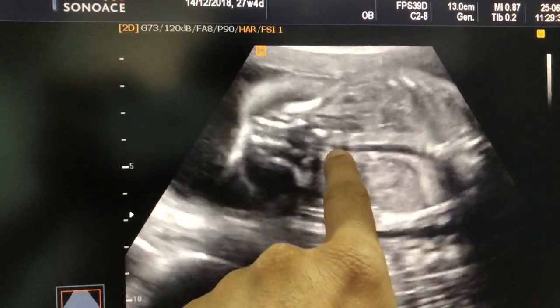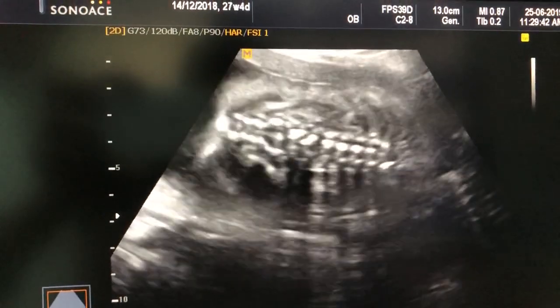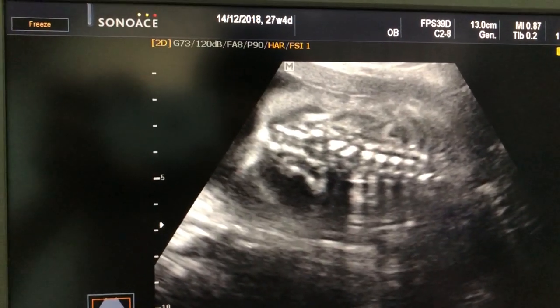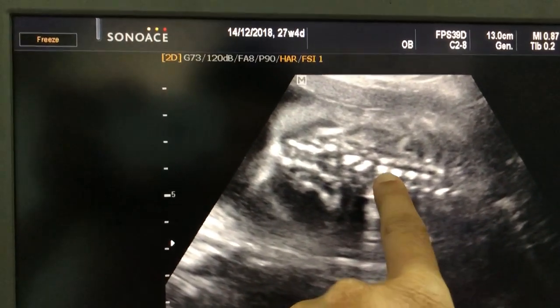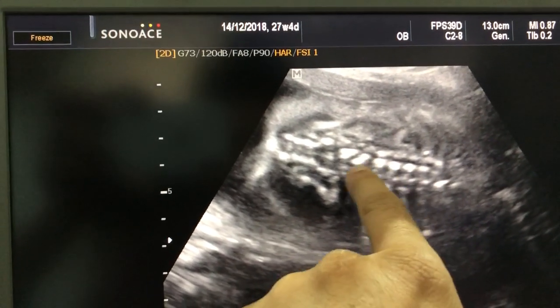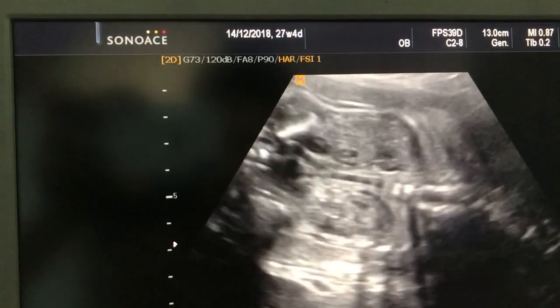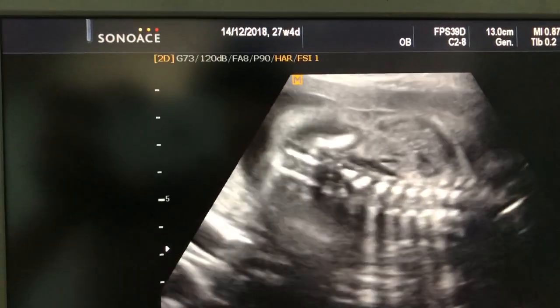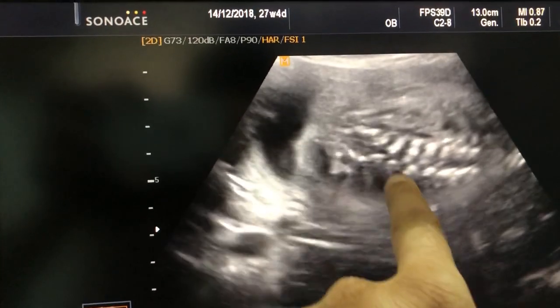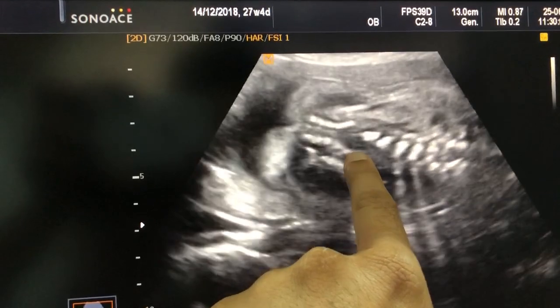and these spinal elements are also not clearly well aligned. You can see here there are dots, and here it becomes a vertical or oblique line. So these elements are also somewhat malaligned, and here is the fusiform dilatation of the spinal canal once again.